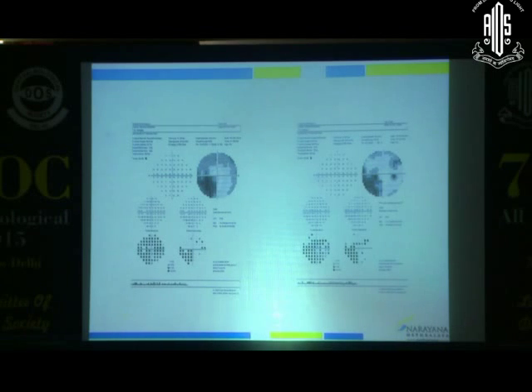So we know it's bilateral, so the lesion is definitely behind the chiasma, agreed, right? So then we go to the next question. Is it following the vertical and the horizontal meridian? In this case also, right? Yes, right. So then we go to the third question. What is the pattern? It's within the vertical and the horizontal, so can we call it a quadrantanopia? Right, so it's a quadrantanopia, and where is it most? So which side is it? So the left side, it's homonymous because it's on one side. So it's a left homonymous quadrantanopia, right?